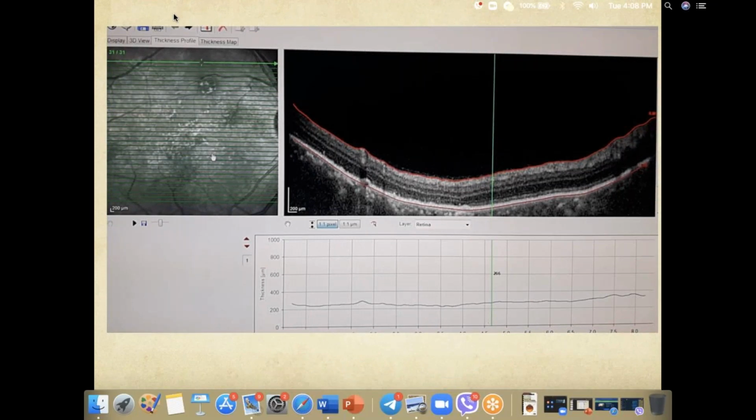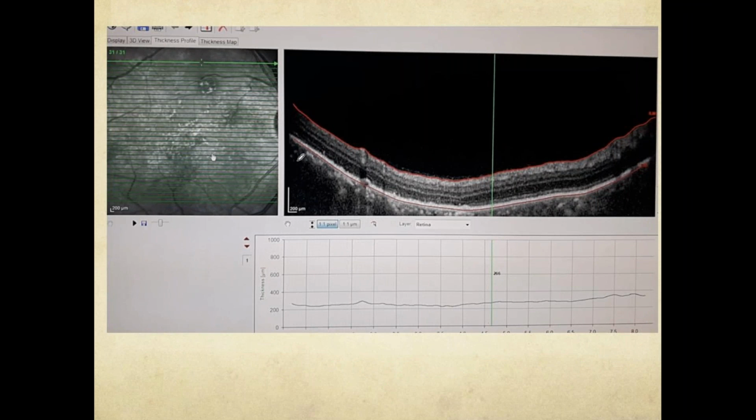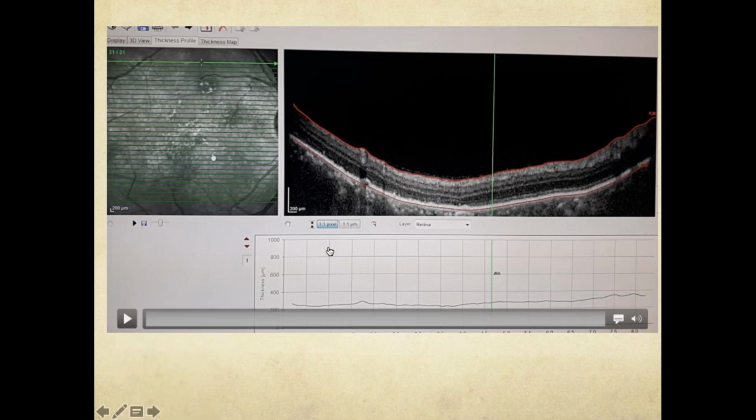So I will just show you this slide. Actually, this was an interesting case that we diagnosed when I was a resident. I was in, I think, second year when we... wait a second. So take a look at this.